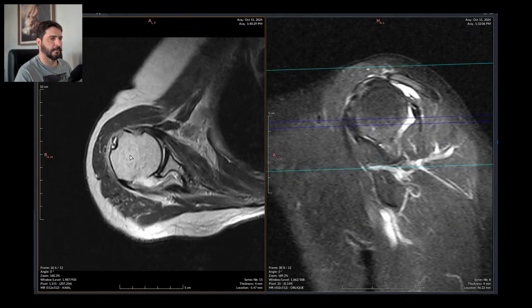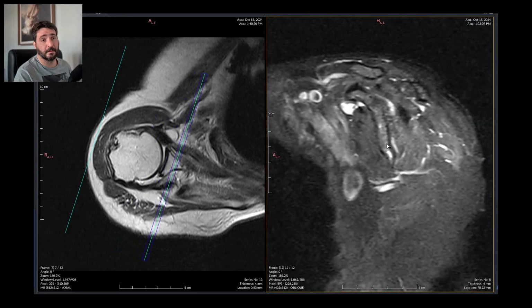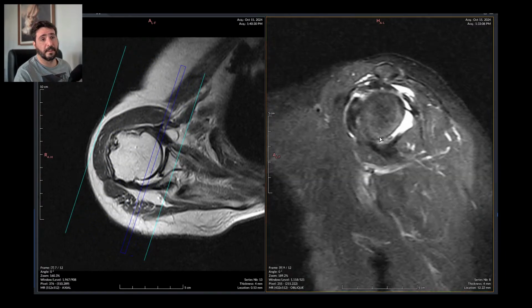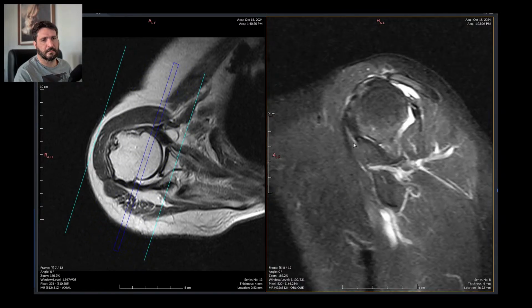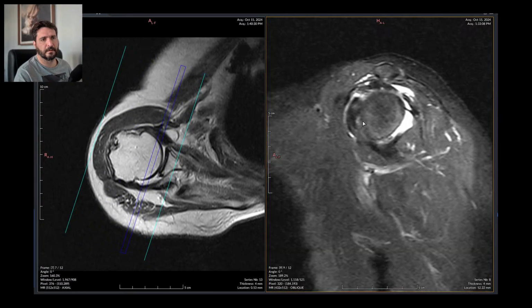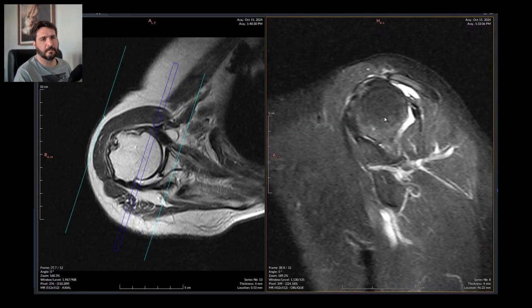It's just wrong. See? It's angled all wrong, and it just misses the end of the supraspinatus tendon right there. It's so difficult to see on these thick slices, because they make 4mm slices in those old scanners. So I think there is something missing right here. Probably there is a tendon missing here.